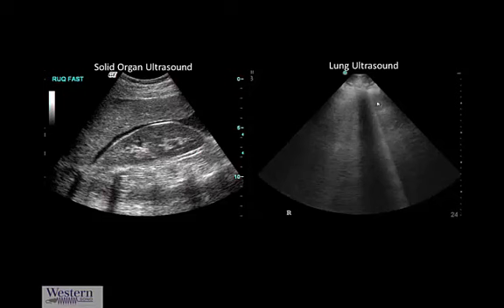But when you show somebody this and try and tell them that it represents pulmonary edema or ARDS, it's a bit more of a leap of faith because it's artifact driven. As you increase your proficiency and your use of lung ultrasound, however, these artifacts become a new language, and your fluency in interpreting them and acting on them becomes greatly simplified.